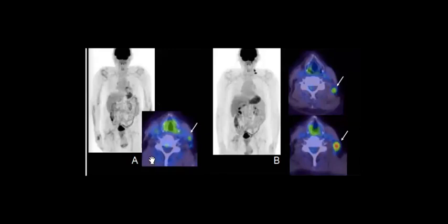That's what I want to tell you, that sometimes the vocal cord, not sometimes, when the patient talks, like a normal talk, it can show high uptake, which is normal. This is one of the pitfalls: when you find the vocal cord with high uptake, as here, this is normal, physiological, okay?